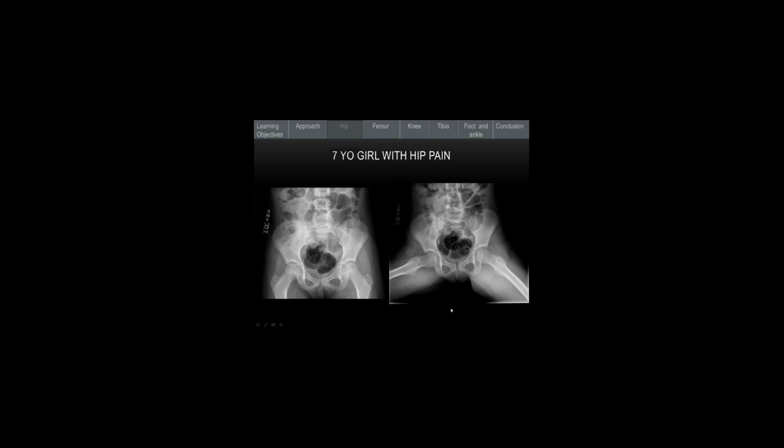In many cases, the radiographs are not able to give us much information. However, if there was a fracture or a large tumor, especially if it was erosive, we would be able to see it. In this case, some very astute radiologists may have been able to pick up some findings, but in many cases, most of us would say that this is not instructive.